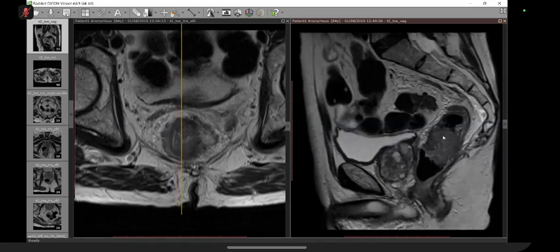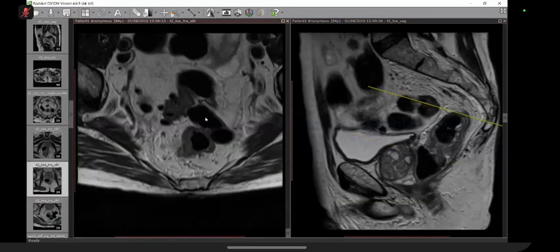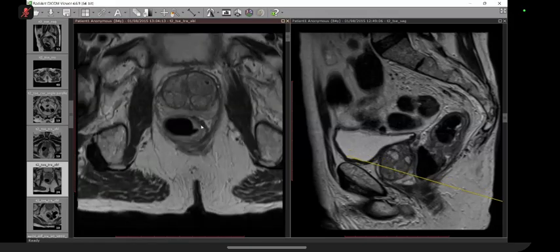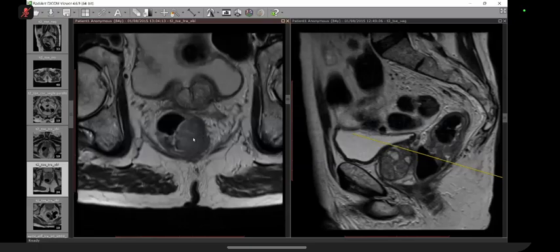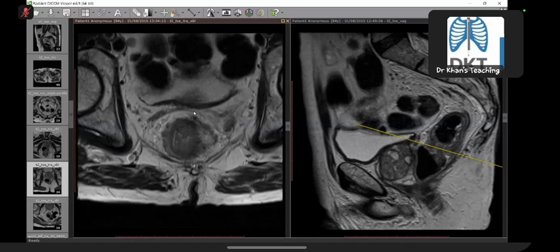So let's go to the axial. Now on axial, I am down here. I am at the level of prostate. As I'm coming superiorly, this is still the prostate here. So the tumor comes into view. Tumor is breaching here, where you can see these whiskers. It is breaching. Frank breach here. Agreed? It is going into the mesorectal fat. This is the fascia.